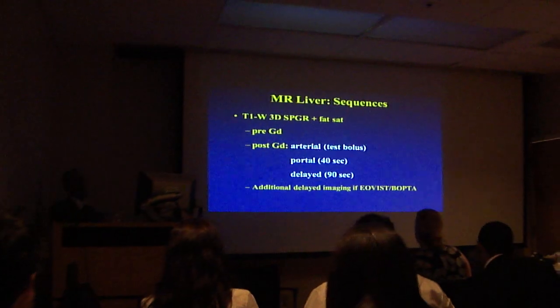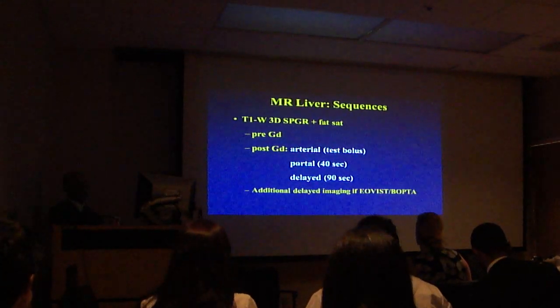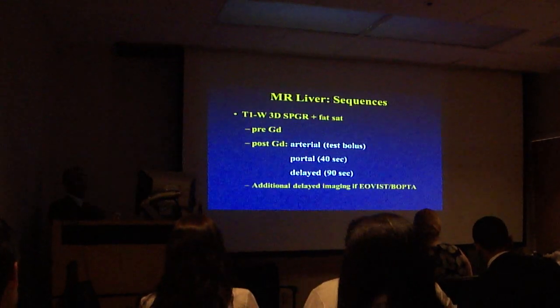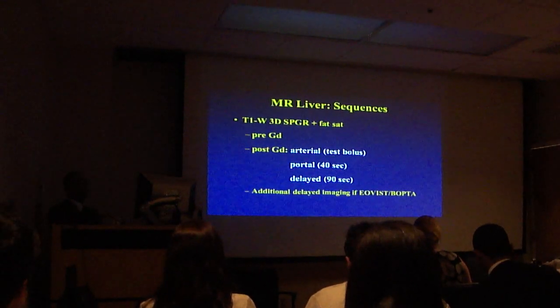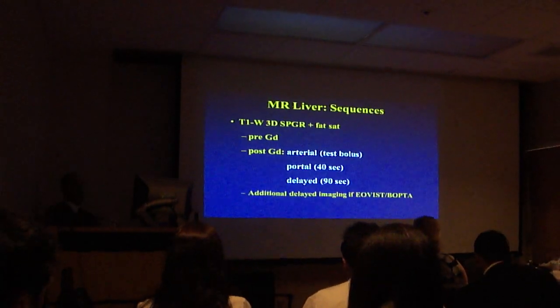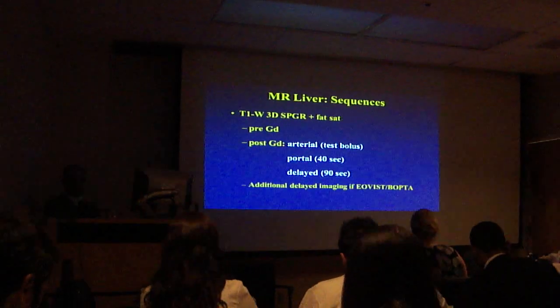Pre-gadolinium images, and then we do post-gadolinium images, which is arterial phase determined by the test bolus, portal venous phase, and delayed. Additional delayed imaging can be performed if you've administered Eovist or MultiHance, which are for certain types of liver lesions.